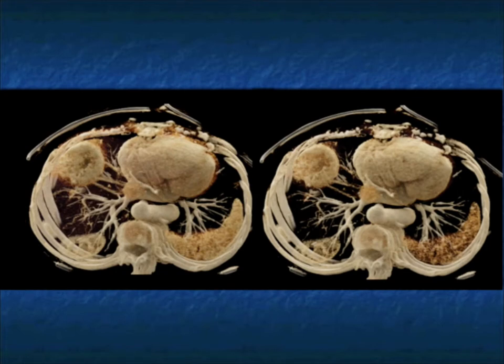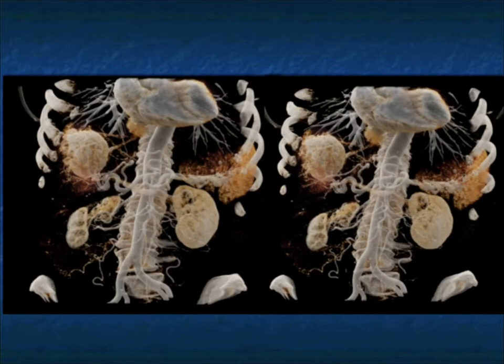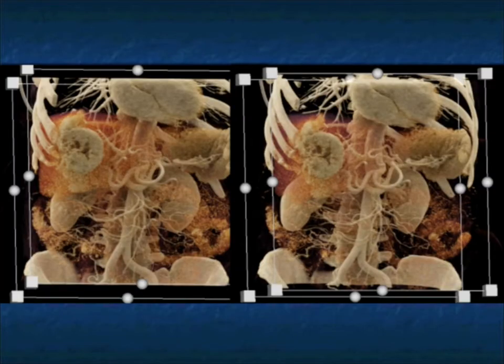We've also been looking at cinematic rendering. Here I've isolated the tumor with cinematic rendering, showing it to you very nicely. Now, in this case, you might have considered surgery perhaps for that dominant mass. You can see the feeding off the hepatic artery. You can see the neovascularity. You can see the mapping. Again, a very nice use of cinematic rendering, and one that I think will be very valuable.